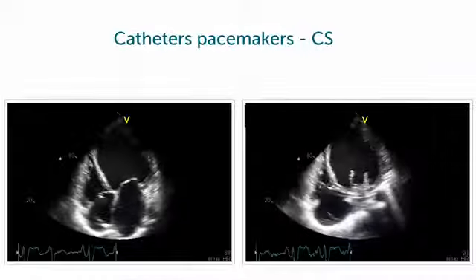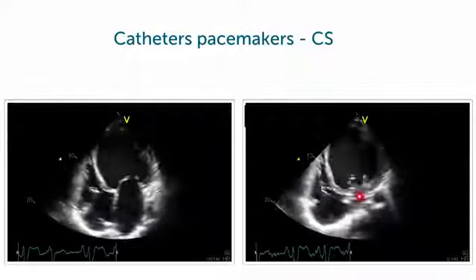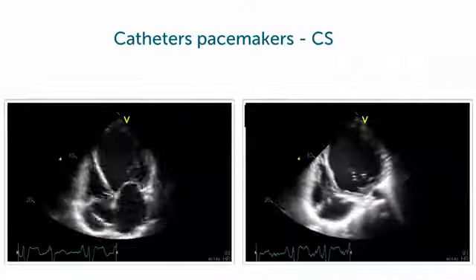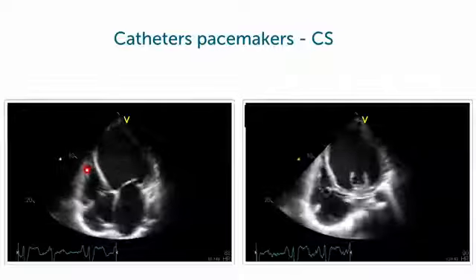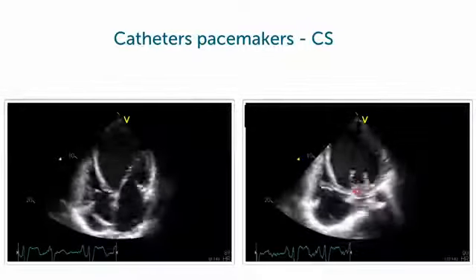And the last example, again a pacemaker, but this time a special form of pacemaker, a pacemaker where we have one lead implanted into the coronary sinus. Right here is the lead. This is a so-called CRT pacemaker, or a tri-lead pacemaker where one lead is in the right ventricle. You can see that right here. One is in the right atrium, and the third is in the coronary sinus. A pacemaker which is used in patients who have left bundle branch block to cause resynchronization. CRT therapy.